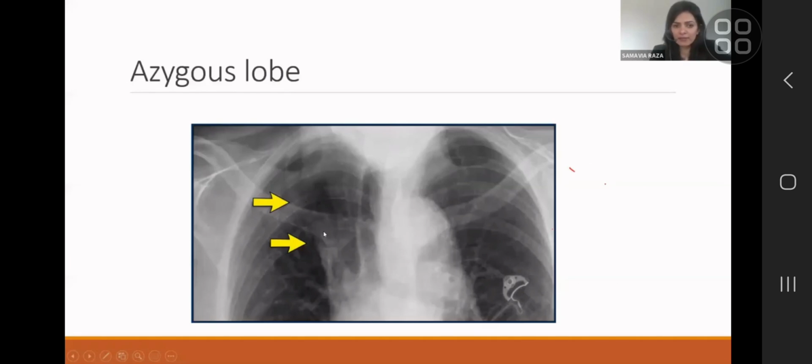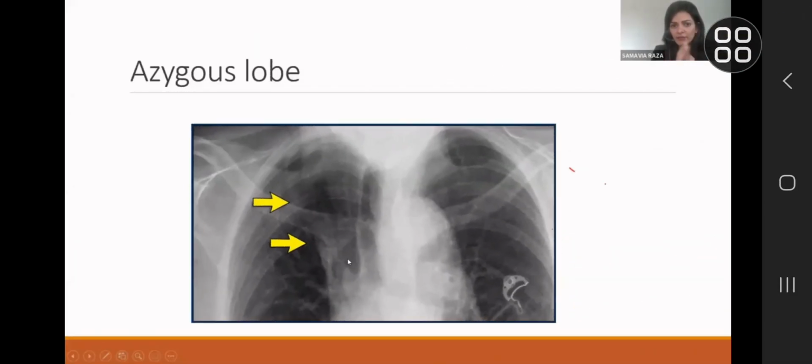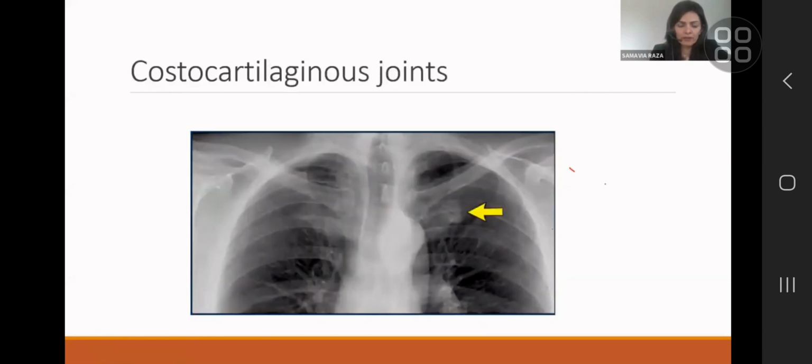When you have the azygos line or fissure, it is very common to see that fuzziness there. It is only because of the anatomical orientation of the fissure, and it's not pathological. That's not to say that you can't still get consolidation in that part of the lung, and it's very reasonable for somebody to say, oh, I can't exclude superadded consolidation, although that looks like azygos lobe. And over time, you gain the confidence to call it the more you see it. The other most common overcalled pathology.